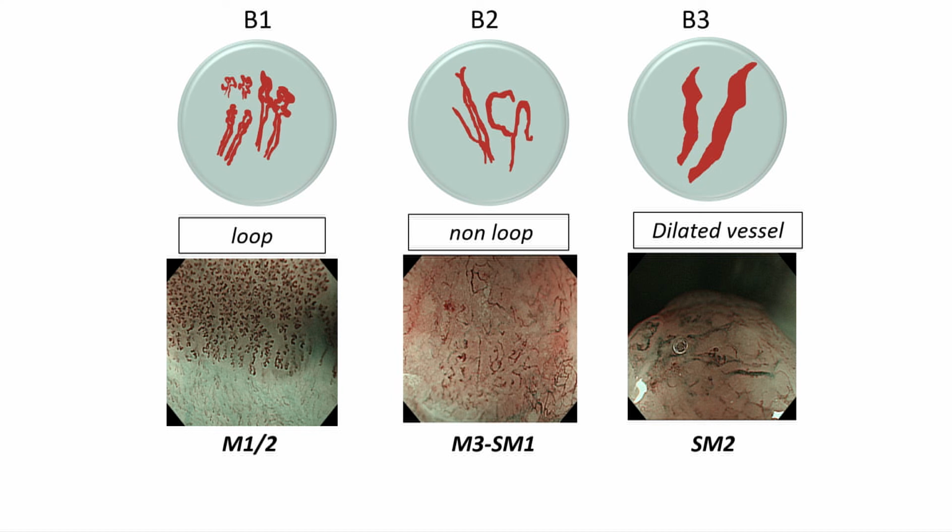So when you have this, it's good for an endoscopist, whereas that is good for the oncosurgeon or radiation. Basically, to understand the pathophysiology or natural history, if this progresses to this, it means conceptually the vascularity will decrease or the bigger vessels become seen, so that gets focused in conceptually.